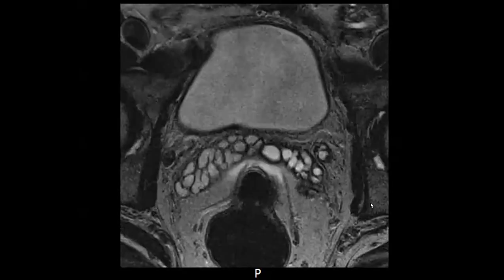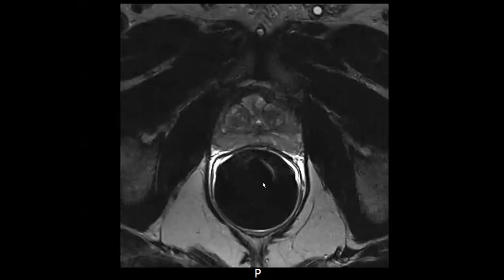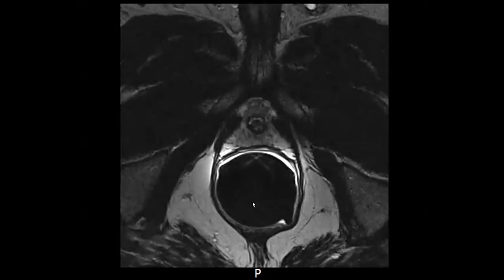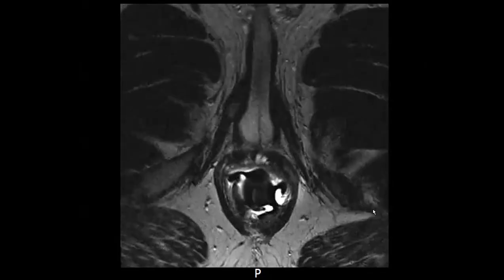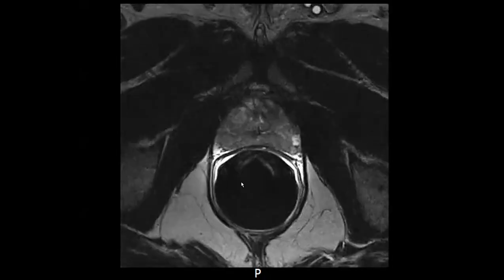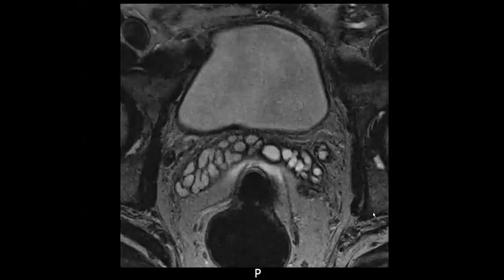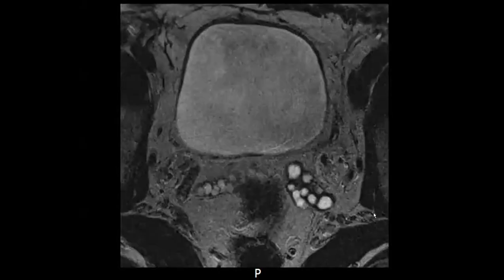Nice. Is that just air in the rectum? Why does it look so cylindrical? So that's the probe. Previously we used to put this in. You guys don't still use it? No, this is an old scan, I think from like last decade. So yes, we used to use a rectal probe for prostate cases as well, but we don't anymore. Great case.